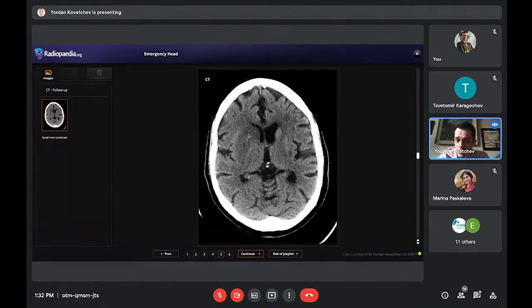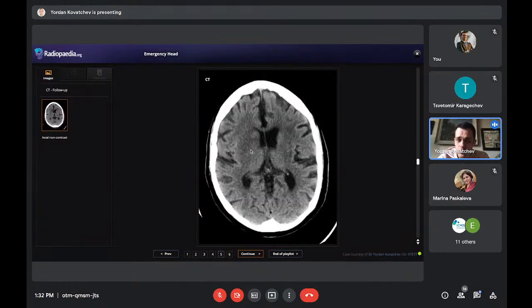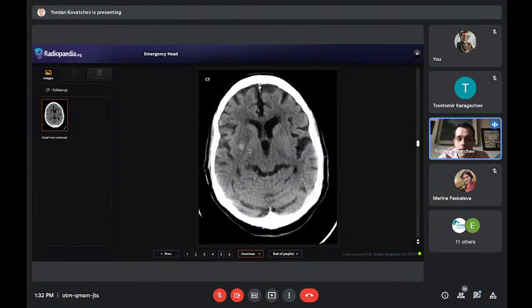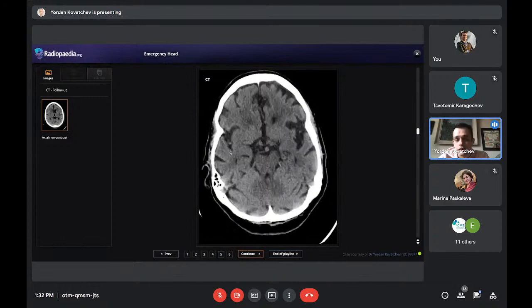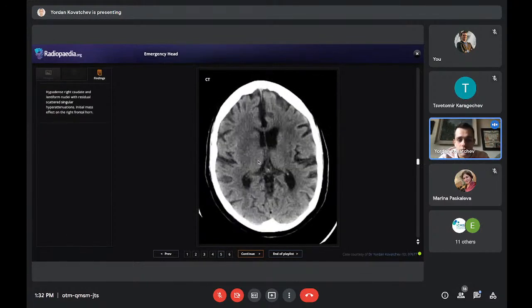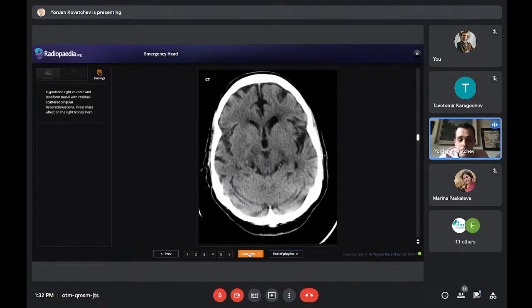So this is a good sign. The procedure was successful. There are no major complications. The best that could be done for the patient was done. And yes, let me see if I missed something. Yes, scattered hyperattenuations. And this is basically it.